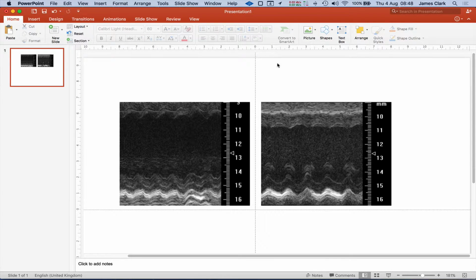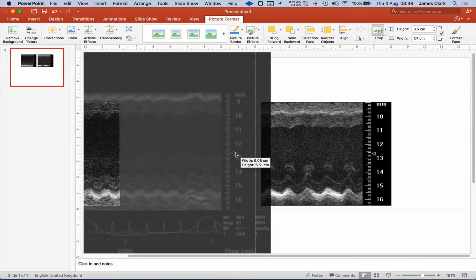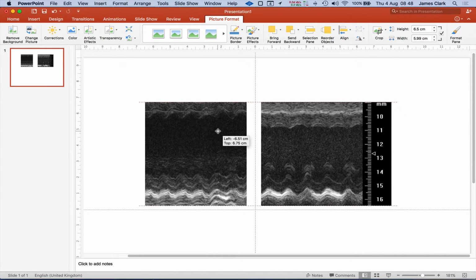And if you don't believe me, you can have just a wee look at those lines. They're all lined absolutely perfectly up. I can then crop one of the scale bars out the way, so I can go to the crop tool. Let's just remove this scale bar. Place them next to that one, and you can then compare the two.